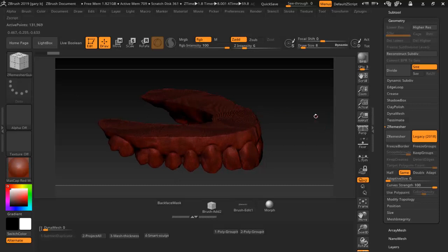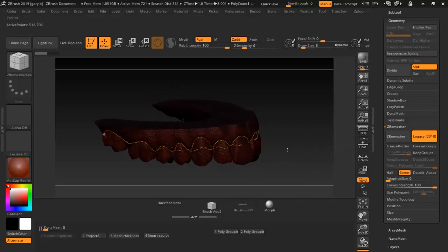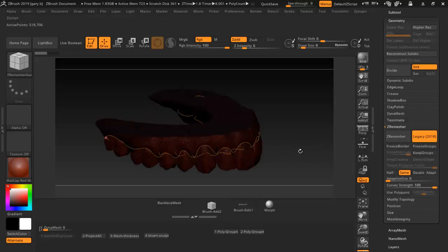so what we'll do is go back here, and we're also going to try the Alt click. So we'll Alt click this. I paused the video, and you can see there, you'll know when it's working because it'll polygroup it. A lot of times these polygroups will look very similar in color, so sometimes to check that, you'll need to Control Shift click to see whether this is or isn't polygrouped.